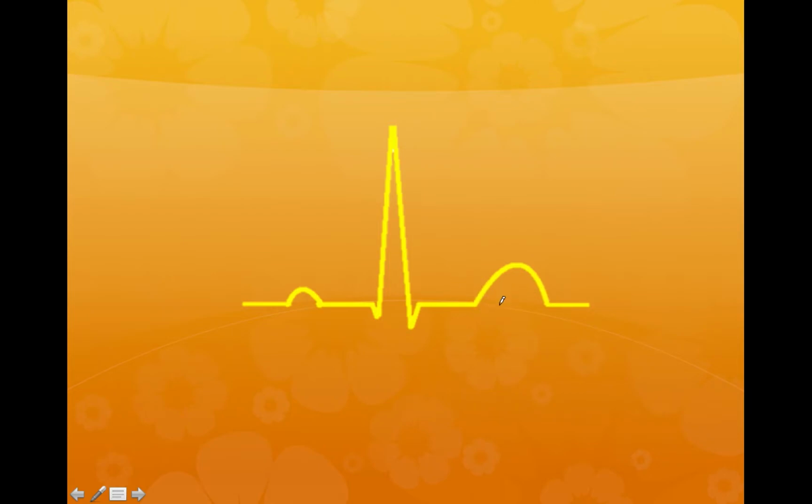It should also be relatively small with respect to the QRS wave. So if you've got a bit of a chunky T wave like that, that might signal abnormality. Or alternatively, if you have a very tall T wave in comparison to the QRS, that would also be abnormal as well. We should also have, like I was saying, this gradual slope. It can sometimes be a bit more smooth and a bit more of a concave upslope. It can even look like ST elevation in some cases, and we'll get to that in a later lecture.